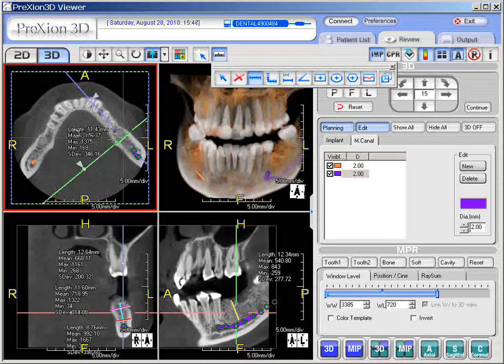Of course, you can always save this too. You can capture this and save it to your output panel, or you can hit this button here. It's the Save Scene button with the curved arrow, and it'll save this as well. So you can save any scene and recall it, which is a nice feature.